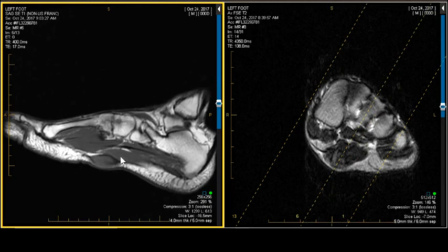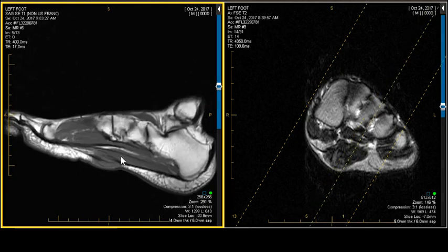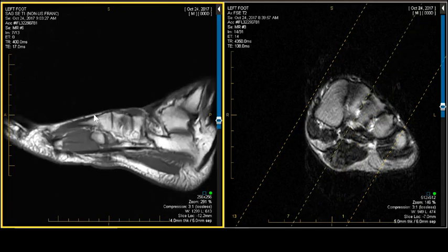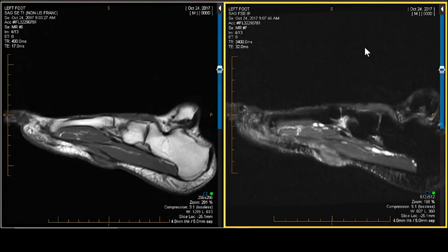So even though I don't advocate operating on these, the really big ones, they're sometimes forced to, so you want to tell them if you are in the deeper space, this one is. You want to give them a length, a width. You want to tell them what cord it's in, the central cord. You want to tell them where it is relative to the metatarsals, so you give them an anatomic landmark. These are not easy to excise.